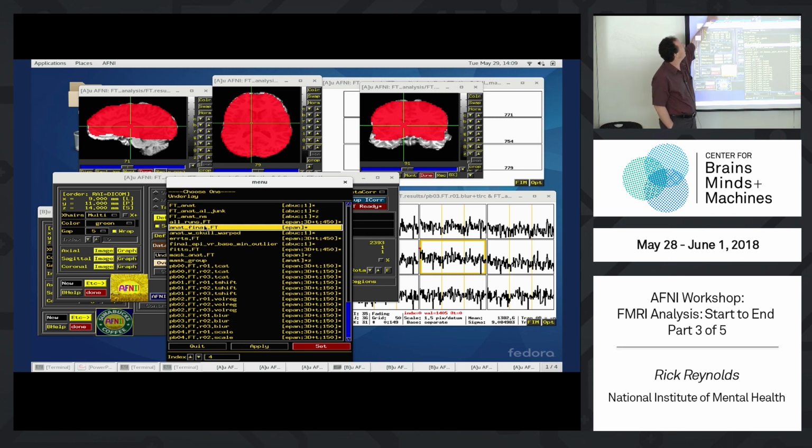So what about the voxels at the edge here? Might you care about them? You might. Might they have actual signal in them that you could evaluate with respect to your experiment? They might. Are we going to necessarily then just trust 3D AutoMask to decide whether or not we should look at them ever? Not a great idea.